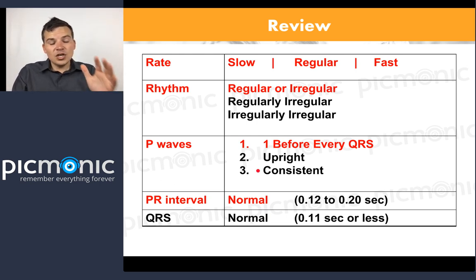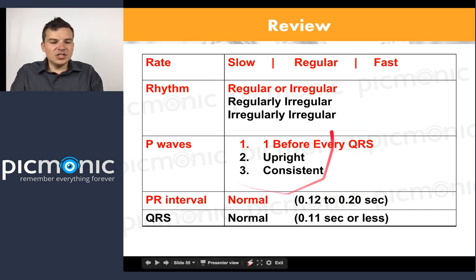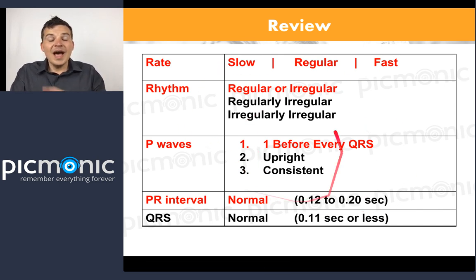And then looking at the QRS last, which is, depending on what book you look at, 0.10 to 0.12 seconds or less, or 3 small boxes. If you're seeing things that are wide QRSs, those are usually ventricular arrhythmias. And that's just what you know. And as I think Jack mentioned earlier, after any kind of ventricular arrhythmia, we usually give lidocaine, and that's right.